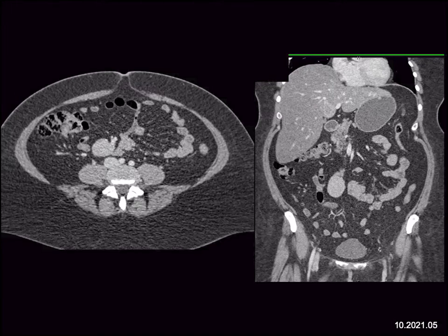Now, there is a thing called Castleman's disease. That's adenopathy that's vascular. It can really be a great simulator of malignancy. You can see it in the chest and the axilla, as well as in the abdomen. And in fact, this was Castleman's disease. The fourth thing is sclerosing mesenteritis. That occurs as mesenteric masses, but about three quarters of the time they have calcification. They're not typically enhancing and smooth like this, though they can be enhancing. They can have a subtle desmoplastic reaction, but nowhere near that of a carcinoid tumor.